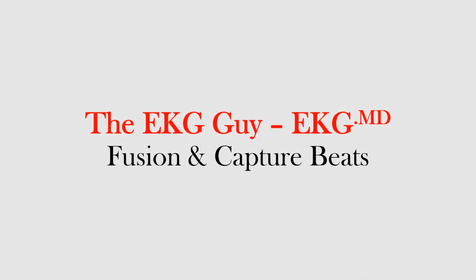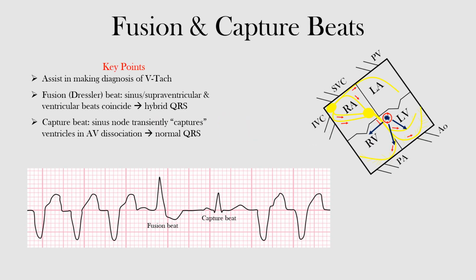In this lecture, we will discuss fusion and capture beats, as well as how they would appear on the EKG. Fusion and capture beats are both helpful clues in making the diagnosis of ventricular tachycardia, or VTach, which is a regular wide complex tachycardia originating from within the ventricles. In fact, some would call these hallmarks of VTach and can be seen if you have a long enough rhythm strip.